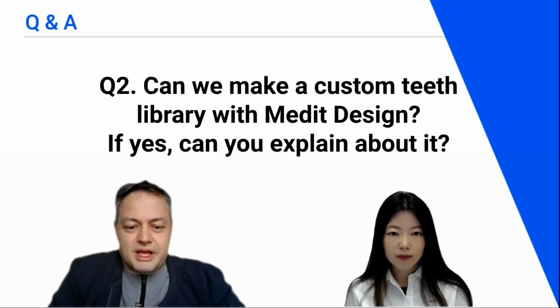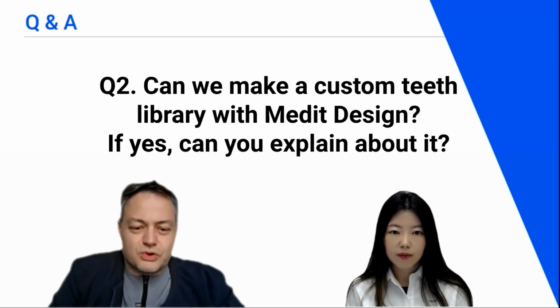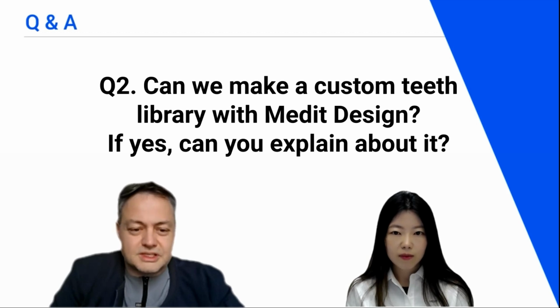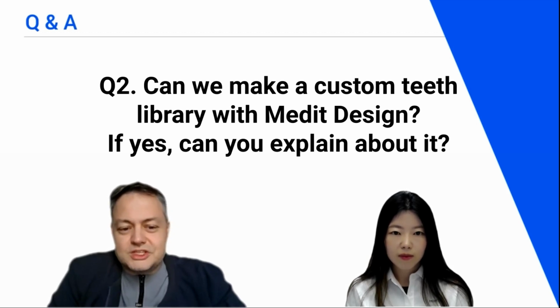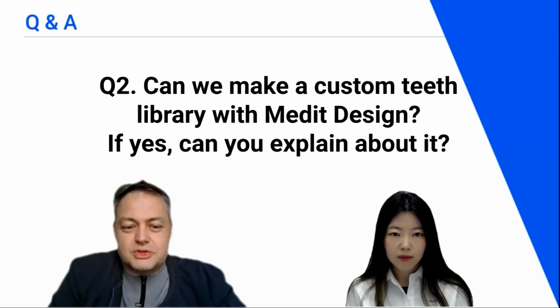You take this base with the teeth, with the new teeth, and go to the orthodontics program of Medit Ortho, and there you can extract all teeth with open bases. This is very important. And now Medit Ortho actually exports these teeth that you actually took from another library in a format that Medit Clinic Cad can use. And now you have the library of this said ExoCAD case in Medit. You just need to do it once to have the whole library there. So I encourage you to do this. Every library that you actually like, you're going to do this protocol one time, and then you will be able to use it as many times as you like.